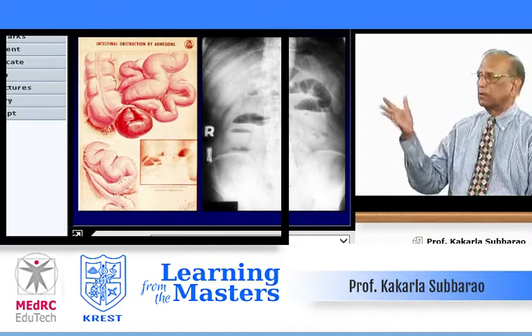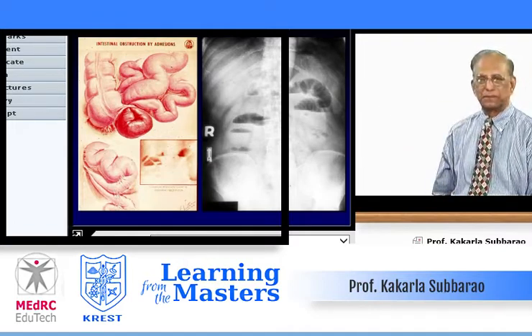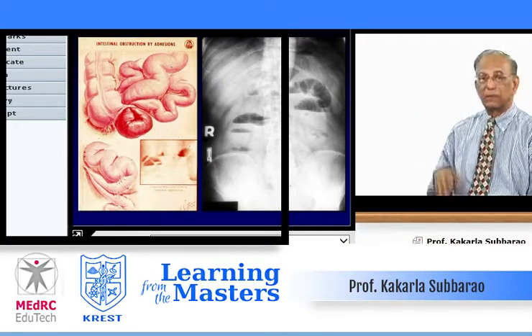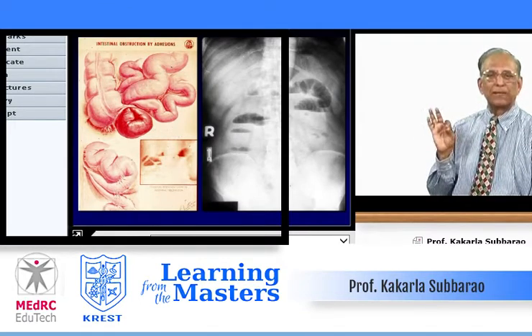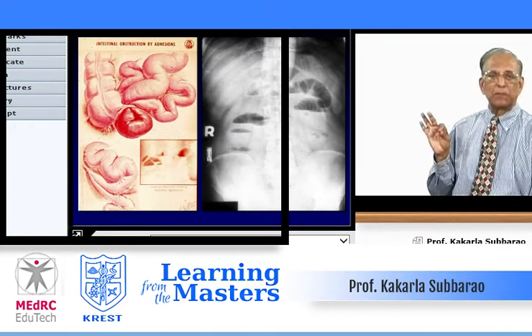Another small bowel obstruction, but then the stomach is distended, and maybe part of the colon also will be seen. Mere air fluid levels do not mean small bowel obstruction. Majority of the time, it is. But sometimes, even in paralytic ileus, you can get them. How do you differentiate between obstruction and paralytic ileus?